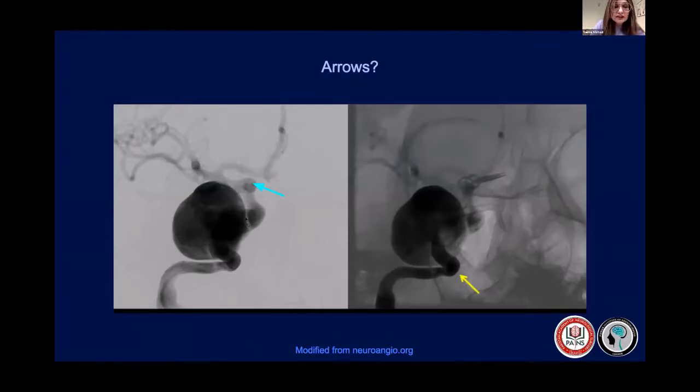So what is this? This is a cavernous segment aneurysm. This is proximal and this is distal, and I put a mark here just to make you realize that this part is supraclinoid. This is beyond the cavernous segment, and this is lateral. This is the point from which the aneurysmal transition begins. So actually here is the neck. And these are the cavernous aneurysms.